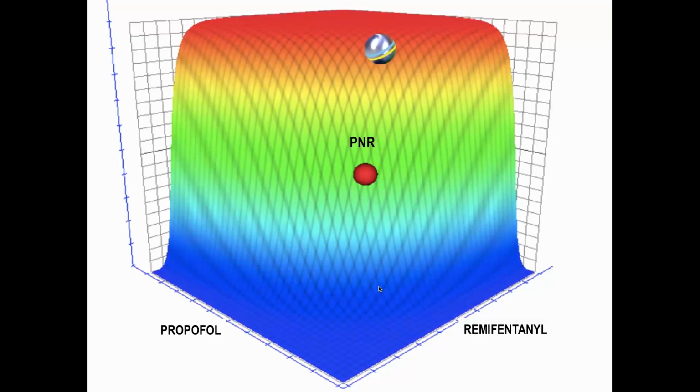Once the objective and the time to reach it have been selected, the software establishes the concentrations of remifentanil and propofol and the infusions required to reach this objective. To navigate in Tacan 3D, it is highly recommended to use the monitoring of the depth of hypnosis and, as much as possible, the monitoring of nociception.